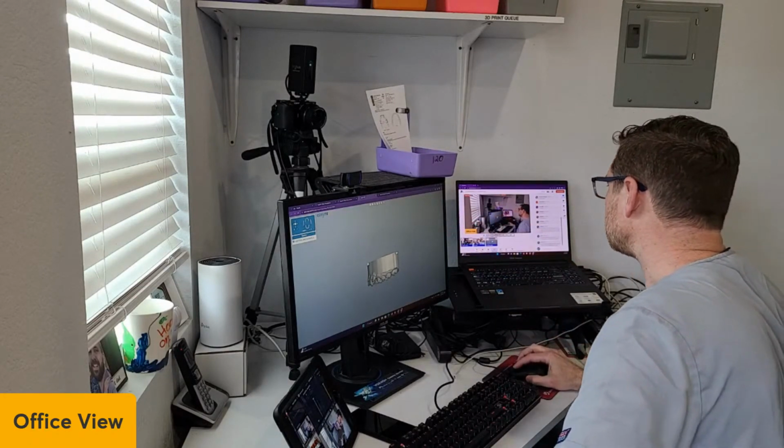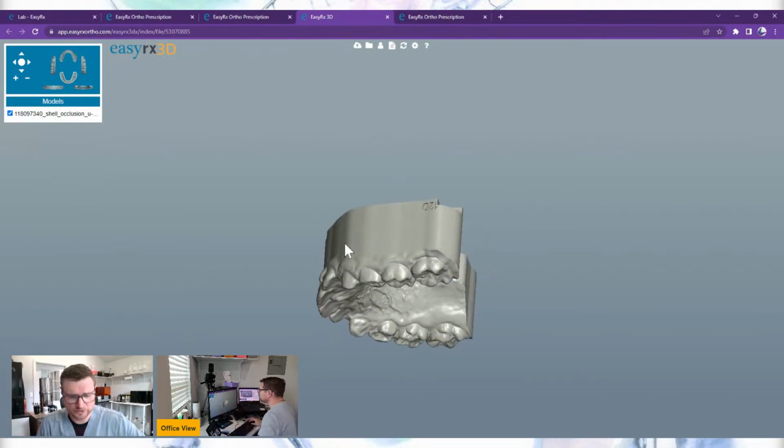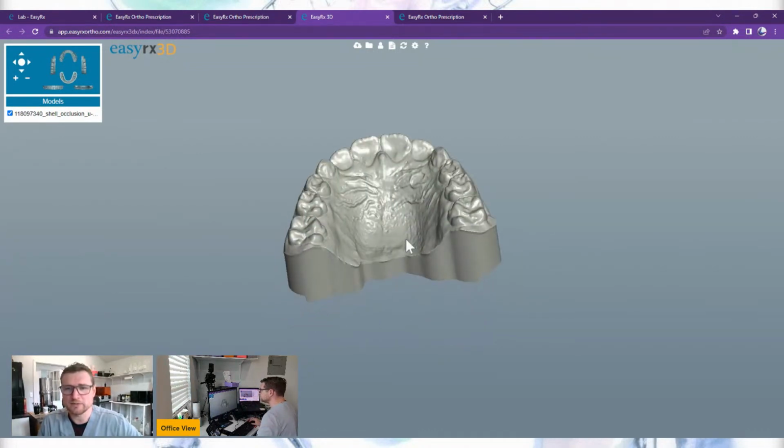Actually, I can share my screen. This would be better than seeing the back of my neck. So you can actually see the name right here, and it will automatically print the name, but you can type in anything you want right there. I don't like this, hopefully they update that. We'll do one manually probably coming up in a little bit, and I'll show you the labeling that I like.